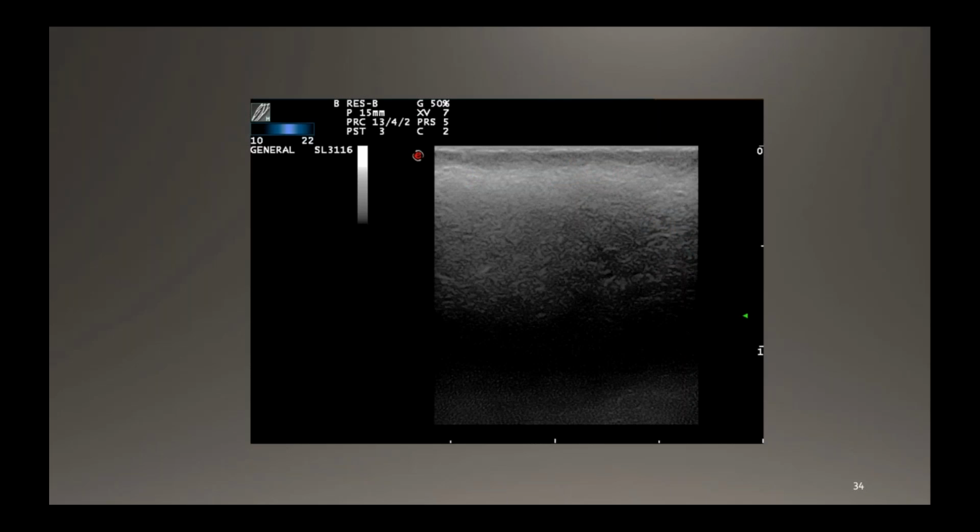That, as Jimena or Orlando will have told you, corresponds to a snowstorm pattern that is correlated with silicone oil, polyacrylamide, and polymethyl methacrylate, which can be related with these two kinds of dermal fillers. Then in this case, there was something that was beyond these little veins that she wanted to be treated. If we had shot our lasers at these lesions, we would have activated this filler, and the patient would have had problems.